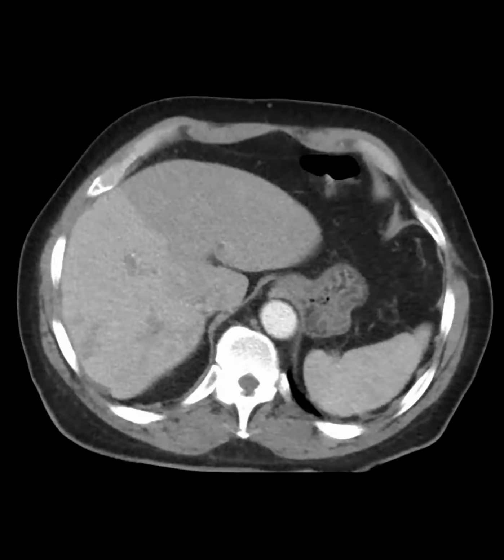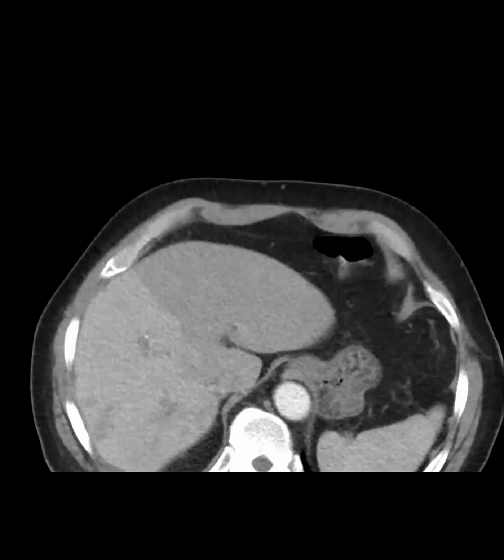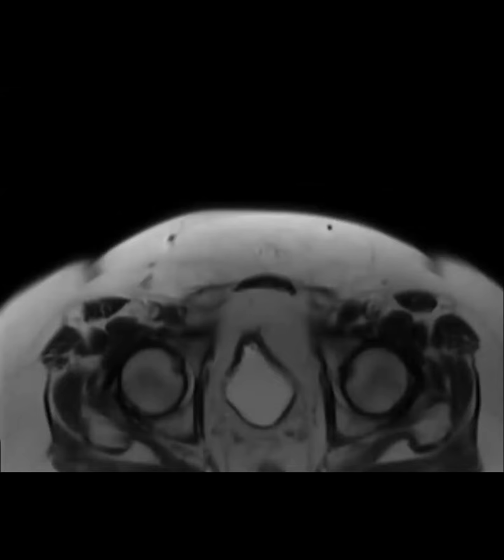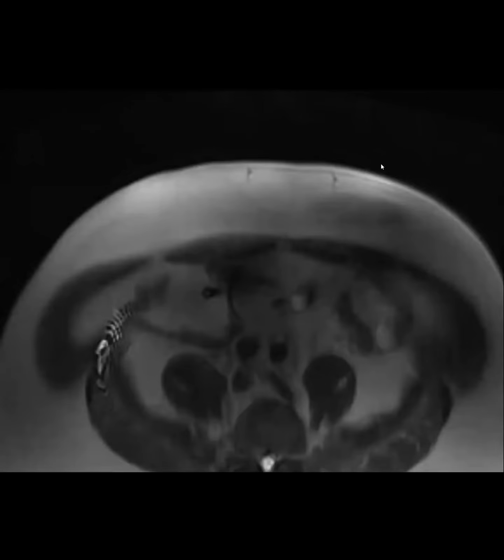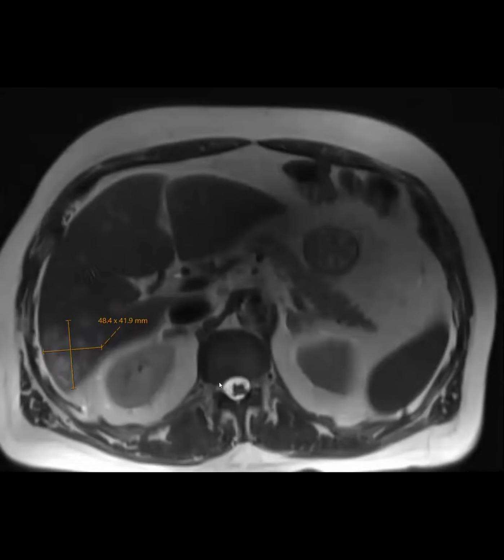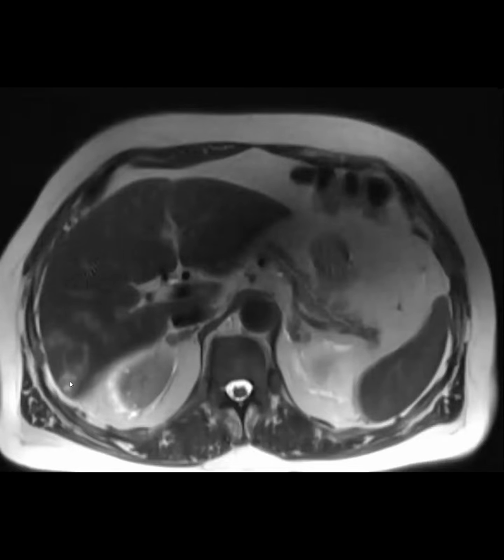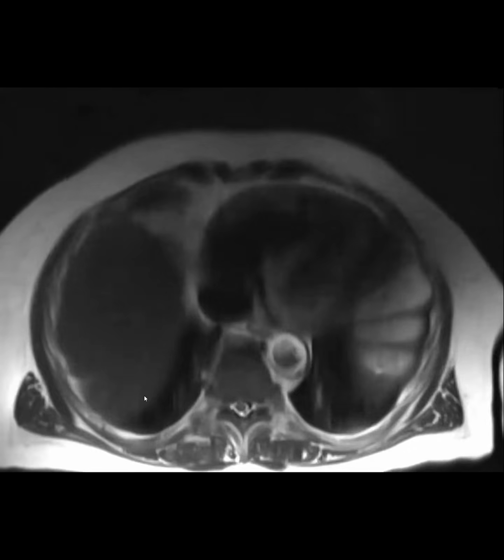So I'm going to show you the MRI now, just to round out our imaging of this. Unfortunately, we didn't have a post contrast because the patient couldn't tolerate it, but we do have a few sequences that are interesting. So we've got this ill-defined stuff that's like phlegmon. Look, these look like micro abscesses with edema, and then up here as well.